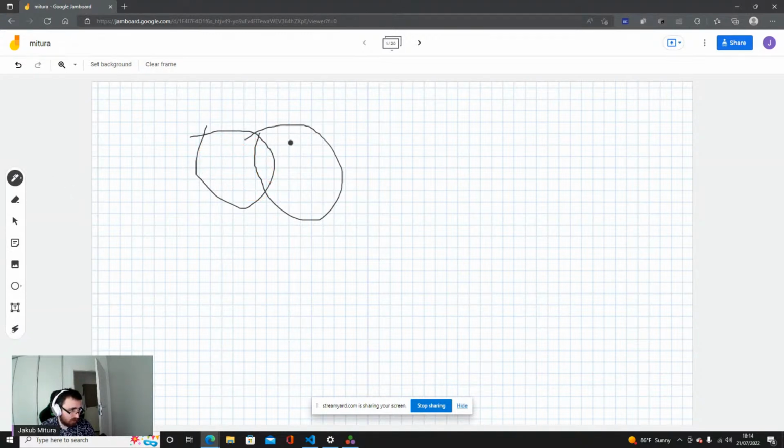So let's say that this is our algorithm output, and this is the true case. The dice score will not look at the surroundings, basically. It will mostly look at what is well recognized, so that our algorithm output found this part well, but it did not find this part, although it should, and it found this part, although it shouldn't.